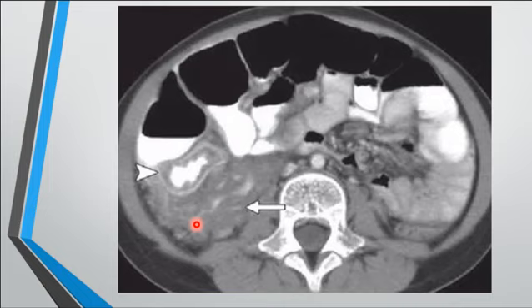And if I had more slices, it would show a connection with the nerve roots and things like that. Bowel thickening is by itself part of the neurofibromatosis. Not reactionary. Unfortunately, I don't have any other slices.